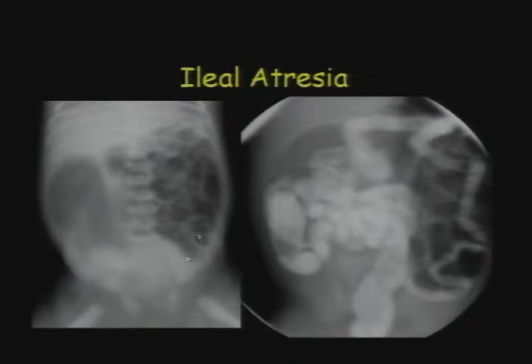So here's a patient who has dilated bowel, especially on the right. When we do the contrast enema, we can see that there is a microcolon over to the right, and then we have a few loops of ileum filling, and then beyond that, dilated bowel. This is an ileal atresia.